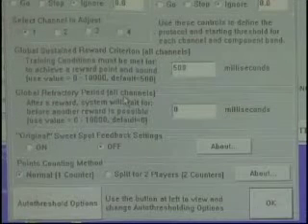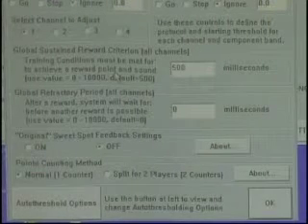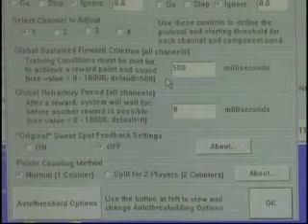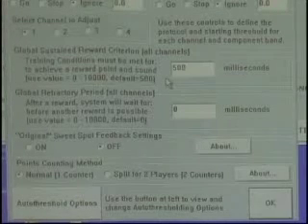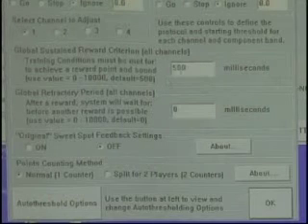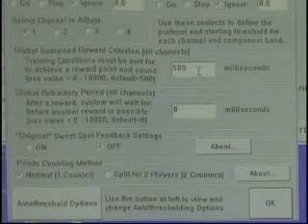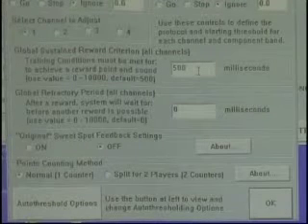Nope. You know what? Scratch all that. I just screwed that up. Okay. Global, that was the next one. Global sustained reward criterion means I met criteria, I've held it for half a second, now I get my tone. Sorry about that. Okay. Did I just confuse everybody? That's for the first tone. The first option, 500 milliseconds, for reward sounds only, by the way. I meet all criteria, I can hold that condition for half a second, I get a tone.